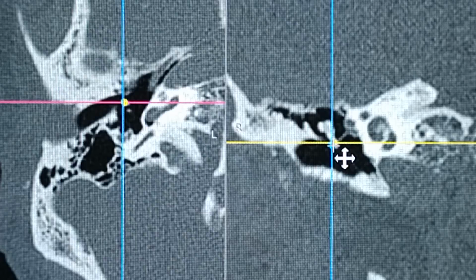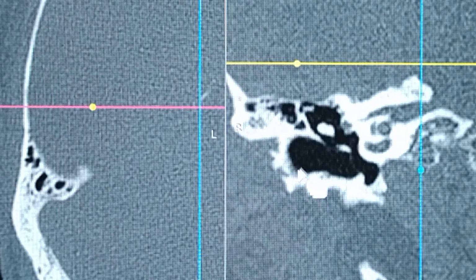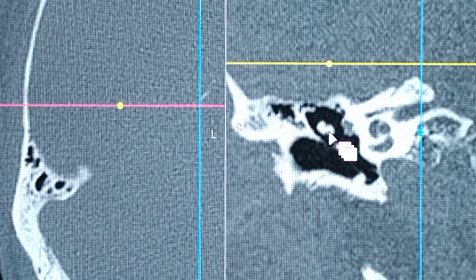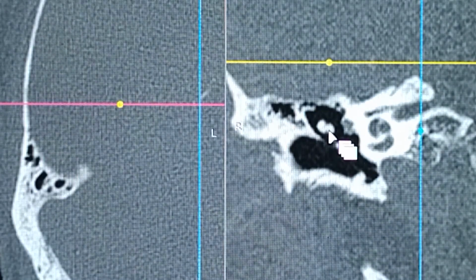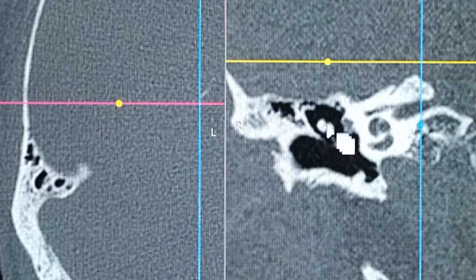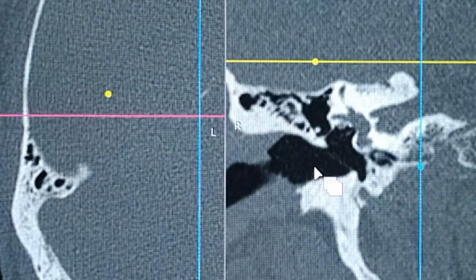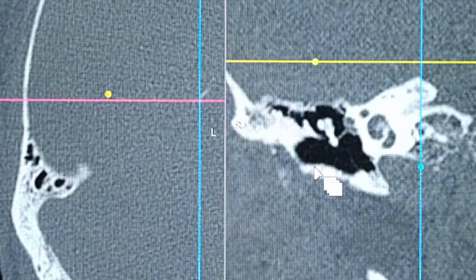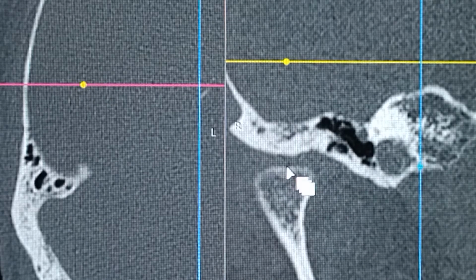Yes, so if you pay attention to this coronal scan right there, you can see a bilobed structure over here. Now if I focus on the screen, you will see a bilobed structure. You can see two circles attached in between, so this becomes a bilobed structure. Now I'm going posteriorly right now. Now I'm coming anteriorly. If I'm coming very anterior, that's the TM joint right there.